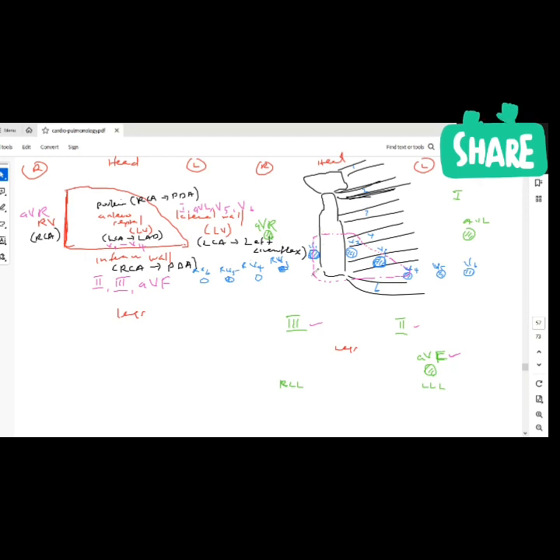So if a patient has a right ventricular MI, I'm going to see it very clearly on V4R, V3R, V2R and so on if I reverse the leads to the opposite side of the chest. That's something else we could do. But you can always still infer that there's likely a right ventricular infarction or posterior wall MI from looking at the inferior wall, since they all have the same blood supply. Make sense? Okay.